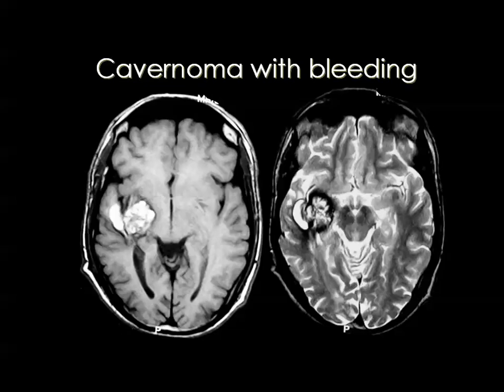Then how can you know that this bleeding is secondary to an underlying lesion? It is the same as with an arteriovenous malformation. The bleeding is in a younger age, and the bleeding is in an unusual location. And this is a cavernoma in the right temporal lobe, and you see this area of bleeding nearby.